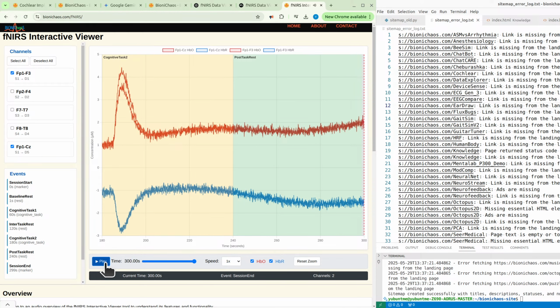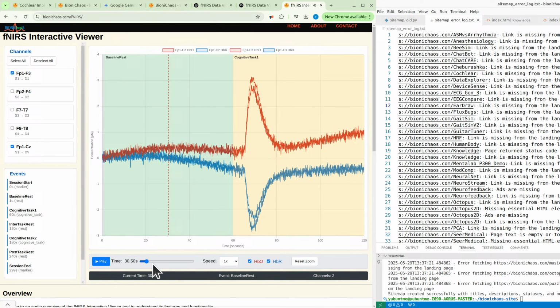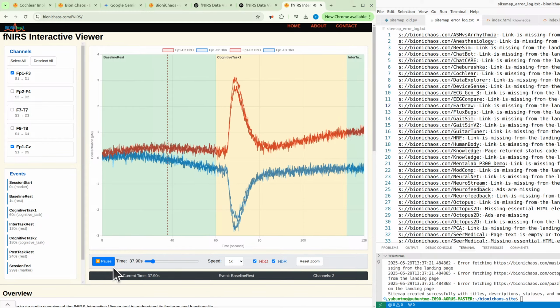And that's unusual. You'd expect more variation between different spots on the head. You definitely would. Different brain regions contribute differently, individuals vary, sensors might have slightly different coupling, plus simple noise affects channels differently. Seeing that level of near-perfect uniformity across multiple distinct measurement channels is, let's say, unnaturally consistent for real physiological data.